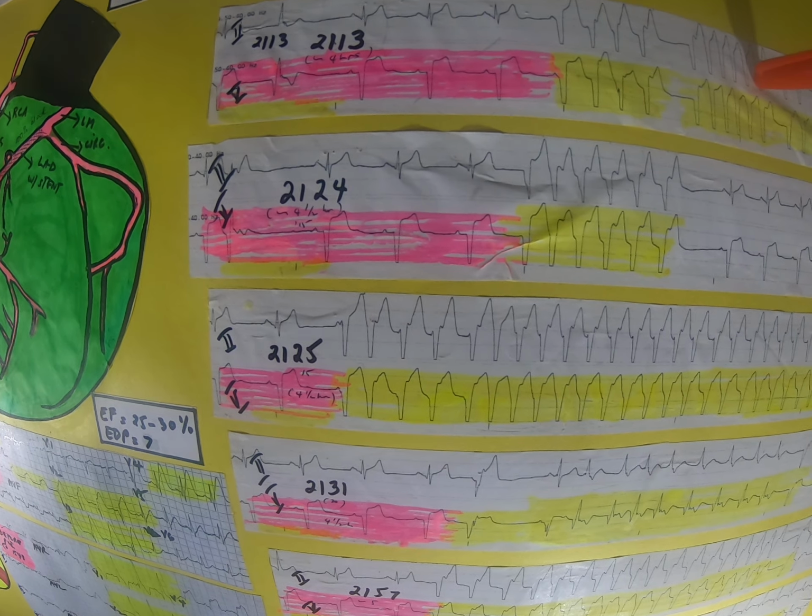are not reentry. Okay, we have a sinus brady in here, and you see that we have a short run monomorphic VTAC coming from one focus, a little pause, and then we have a different kind of VTAC in here from a different focus. The patient is tolerating this.